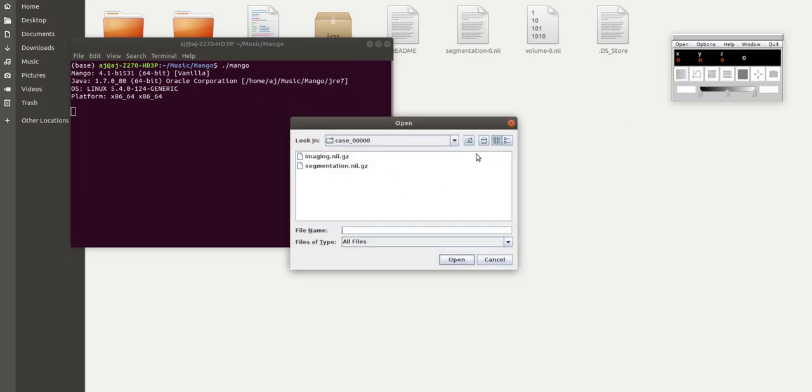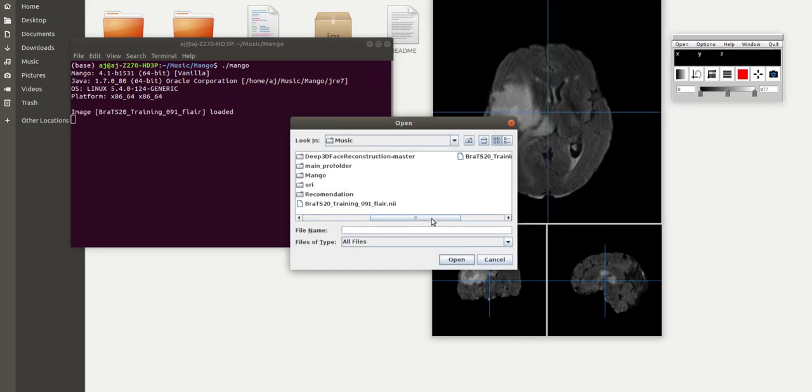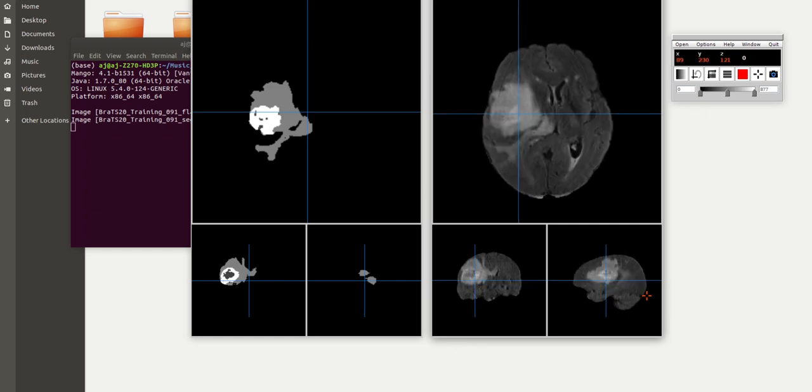I'm showing this because for creating the model, it's really important to understand the data first. Thereafter you can choose the model and what sort of algorithm you require. Understanding data is the most important and key part of any machine learning, deep learning, or reinforcement learning model. So here is the 3D input image, and let me put these lines in parallel.